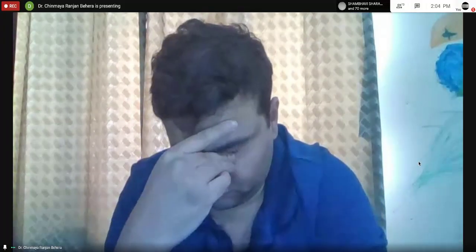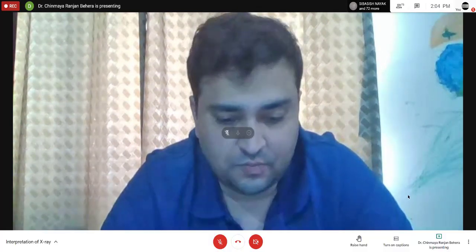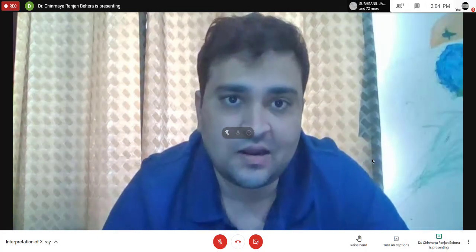Yes, sir. Okay. So today I'll be talking about X-rays, mainly pertaining to surgery, which will be asked in your exam. A few brief points, an introduction about the X-ray: whenever you see an X-ray, there are certain things you are supposed to know. Whichever X-ray you see, there is a white and a black, and in between white and black. So you need to know what is white, what is black.